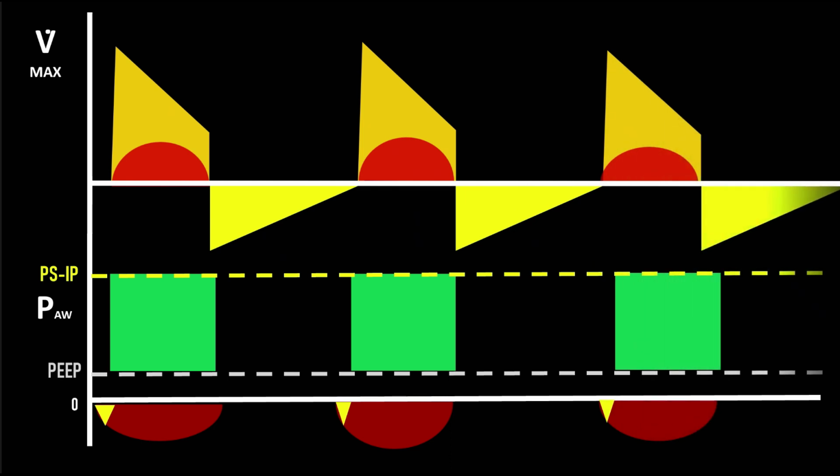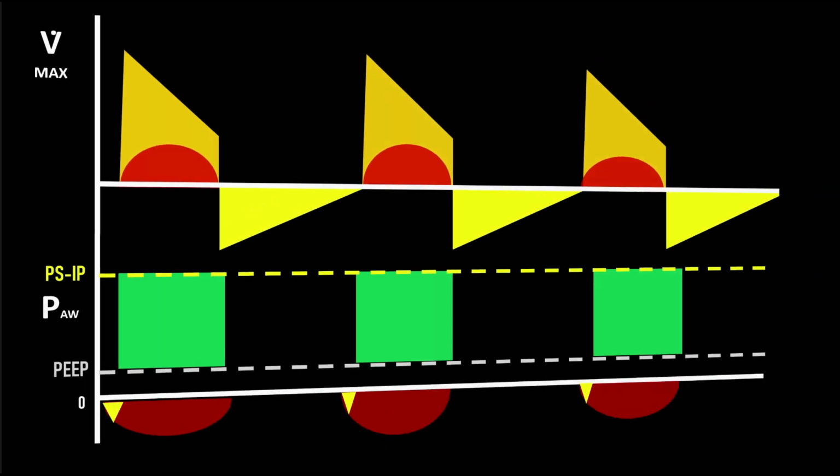If you recall the tutorial on inspiratory dysynchrony, I overlaid the effort that the patient was making in red. So the red bit there on the flow waveform and on the pressure waveform is what the patient is doing. The trigger is that little tiny yellow triangle at the beginning of the patient's negative airway pressure. Flow in this situation, because it's a spontaneous breath, is in orange and pressure is in green. I pointed out that there was no easy way of figuring out the contribution of the patient versus the ventilator in pressure support.